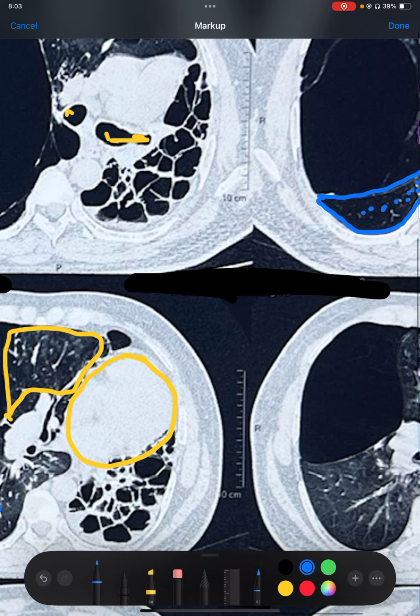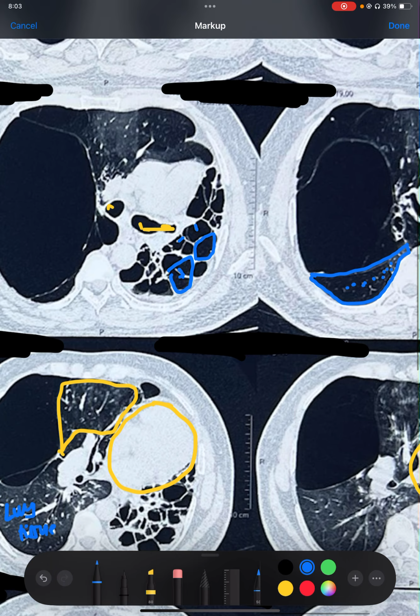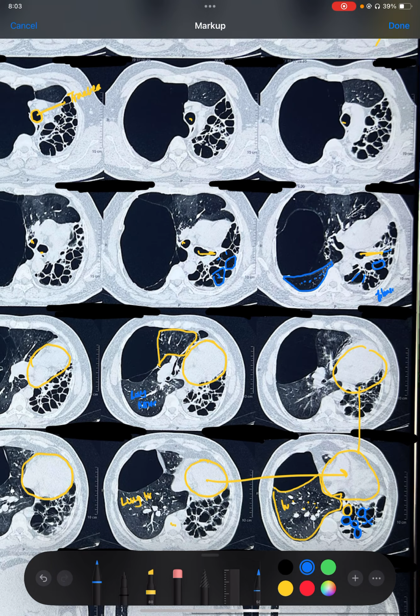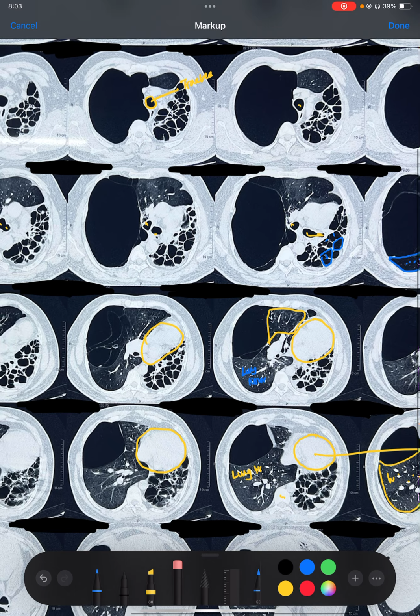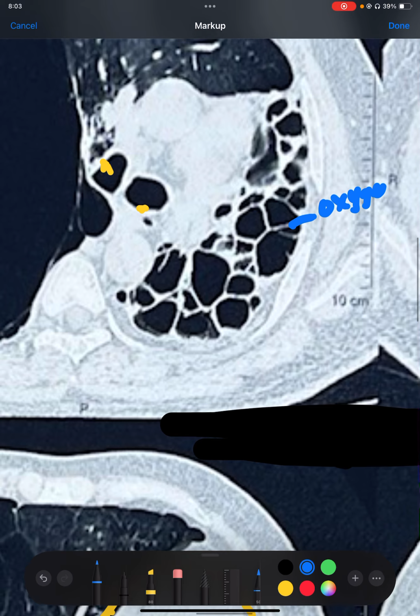But just see on this left side that these are all formed cysts. These are all cysts with the dense white streaks which suggest fibrosis. So this is a very typical example of a fibrocystic disease where lung parenchyma is significantly replaced with cystic lesions with fibrosis. So this lung does not take part in oxygenation. So this lung will not help the patient to draw the oxygen from air to the blood.